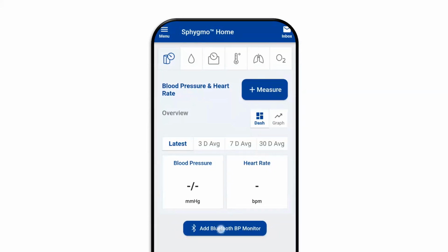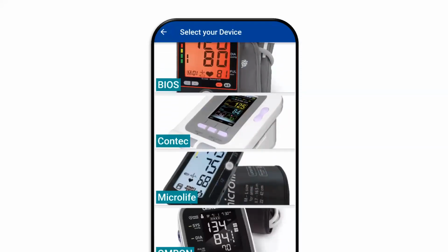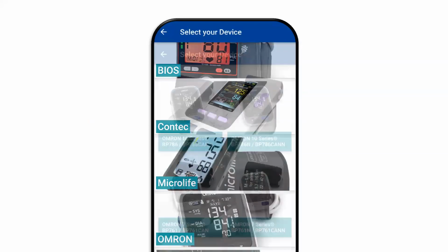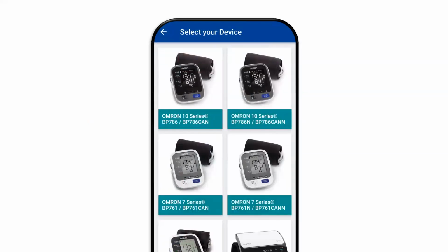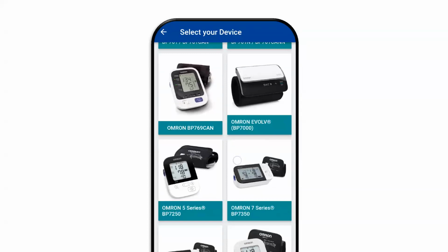Next, you'll have to choose the right blood pressure machine. Scroll down the screen until you find the Omron Machine button. Omron makes a lot of different machines, so scroll down the screen until you see the Omron 5 series, then click Select.